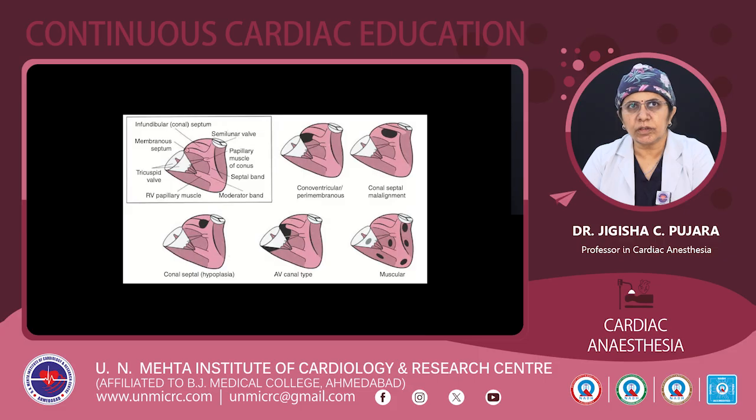Same here in the other figure, various VSDs can be visualized. Conoventricular VSD in the first figure, conal septal malalignment in the second, conal septal hypoplasia, and the middle one is the AV canal type, and the last one is the muscular VSD at various positions as described.